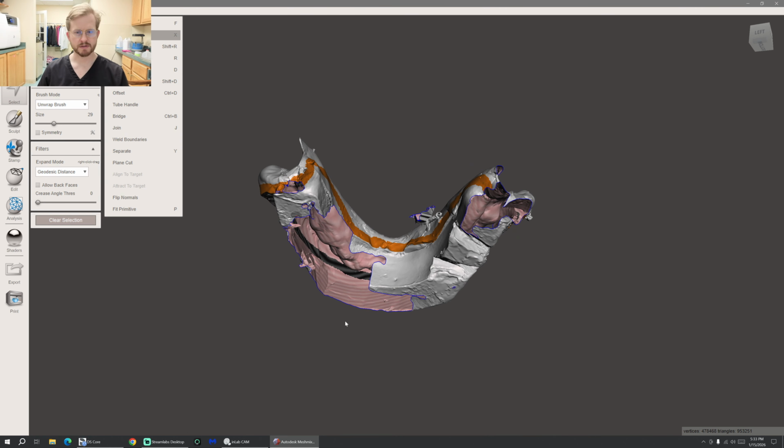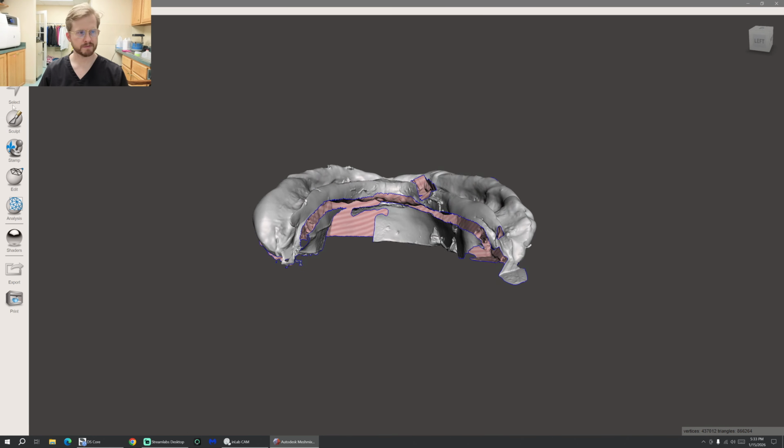Okay, and now we're going to discard. So that gets rid of most of it.